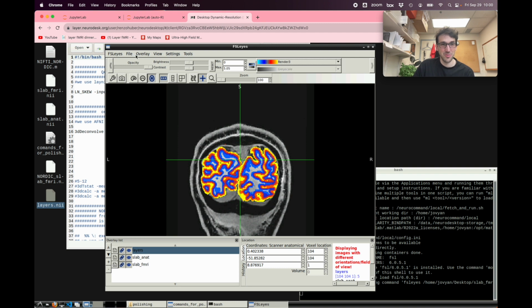I changed the opacity on the top left, so you can see that it matches. Everything that I'm doing here is mostly to show you the pipeline, the logistics of applying those filters. When you apply this on your own data, you might find other ways more convenient or more accurate. So these are the kind of data that we're going to look at.